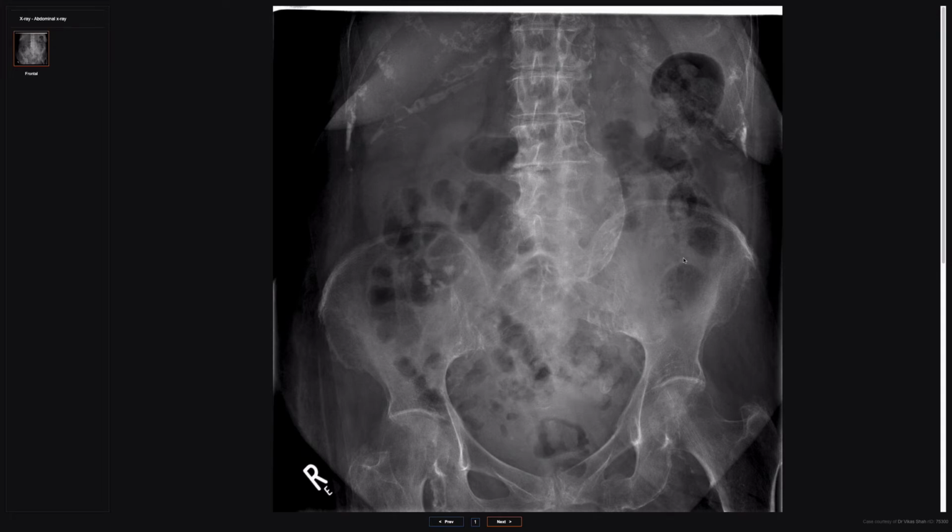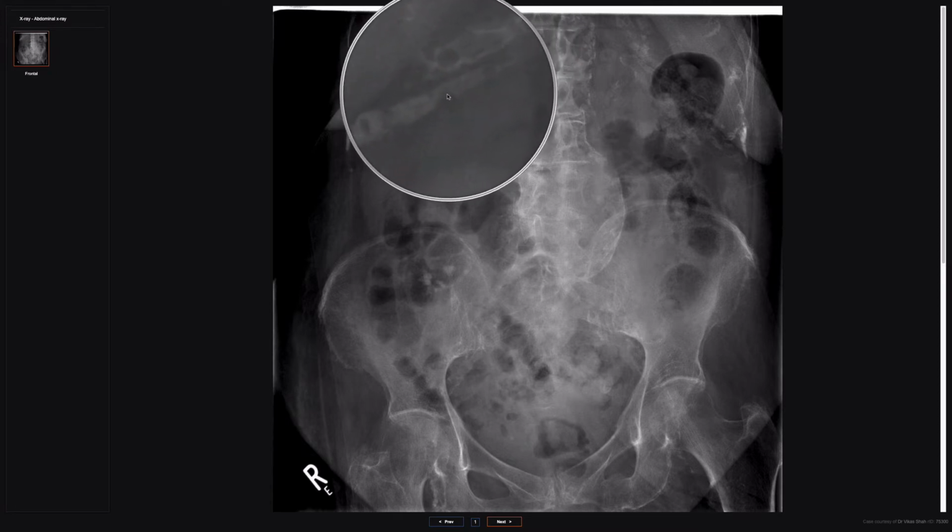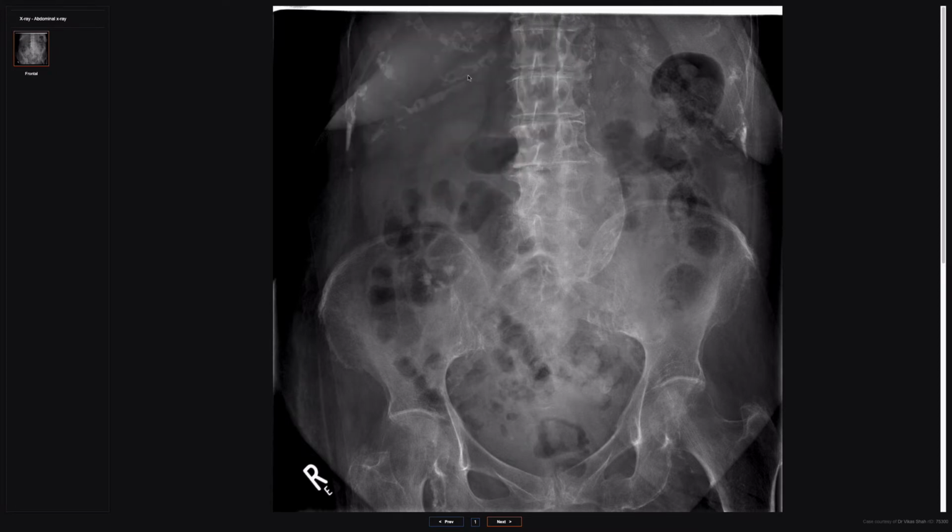Abdominal aortic aneurysms, or just abdominal aorta and iliac arteries, whether aneurysmal or not, can be calcified. In this example here, we've got calcification of an aneurysm of the abdominal aorta. So you may well see this as an incidental finding. And then also this kind of calcification here, which is of the costal cartilages of the ribs. Okay, it can look a bit alarming the first time you see that, but this is just irregular calcification of the ends of the ribs.